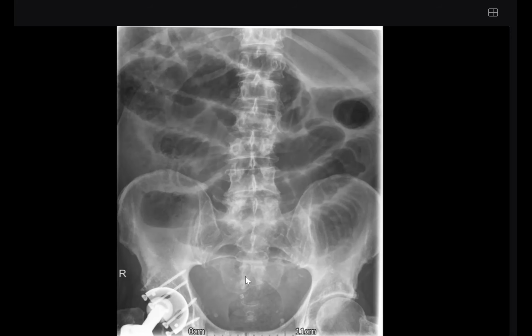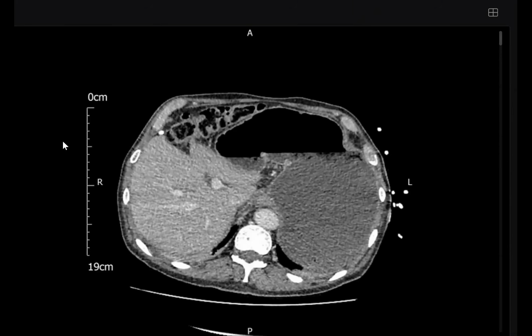You mentioned surgical clips. You suspected air lucency here. No radio-opaque shadow. I want an upper abdominal or lower chest radiograph in erect position to assess the liver and rule out any pneumoperitoneum, as well as an extended view of the pelvis and hernial orifices. Very good, my friend. This case is easy, inshallah. Sir, can I have control? Yes.